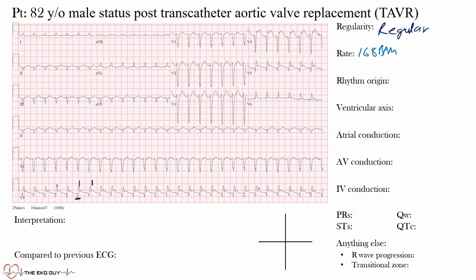The next thick line comes right before the next complex, so it's less than 2. You would do 300 over 2, but it's less than 2, so the rate is greater than 150 beats per minute. That 2 is because of the 2 thick, darker shaded lines. Now the actual machine got 164, so you can see that the first way we did it is a good estimate.